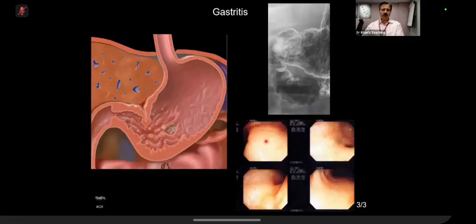What happens is that there is an ulcer, a depression. Around that is edema of the mucosa. So a similar thing projects here on a barium examination. In a dependent portion, the barium pools and the surrounding edematous mucosa gives you this low density. So this is an aphthoid ulcer.